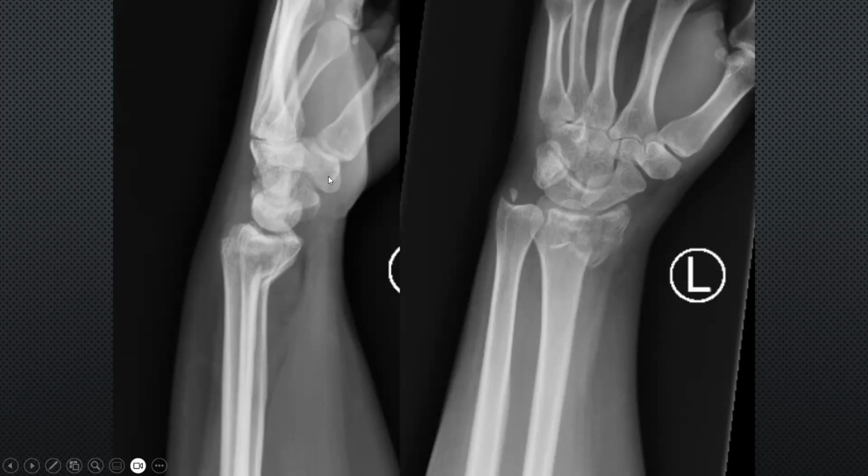The carpal bone here, right? This is the palm, right? And if you put the midline here, this line, the radiopalmar or radiocarpal line, okay? So is the hand volar or dorsal to this line? Volar. The palm is here, and the line is behind the hand. So the hand is volar, anterior, easy.